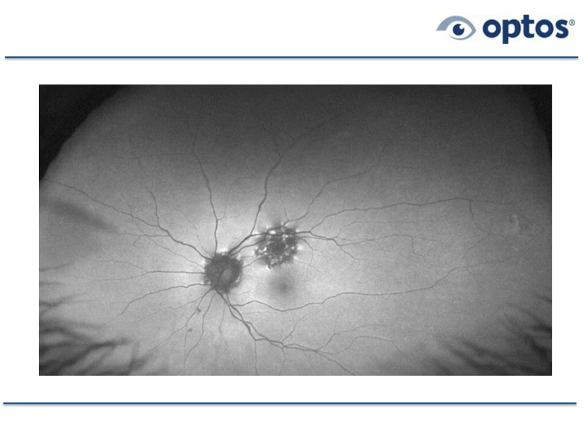But we can see that lesion. And that dark lesion, which is right above the fovea, it's about a disc diameter in size, does have some bright spots around it, suggesting that this may be active. It may be metabolically active, and maybe it will progress. We followed this patient. We saw the patient 2 months later, and here the patient is 2 months later.